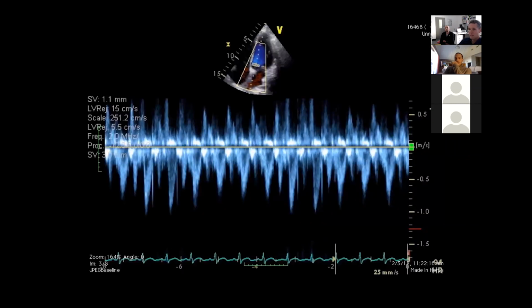All right. So finally, let's talk about fluid assessment. Does anyone use this for fluid assessment, the passive leg raising, respiratory variation? Can you give me an indication of how you use it? And I'll tell you how I do it. If you saw a pattern like this in a mechanically ventilated patient, what are your thought processes? So people often see these kind of swings in the art line and say this patient needs fluid. What do you think about that?